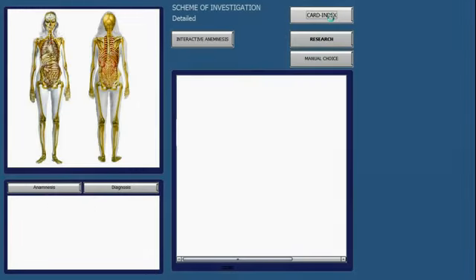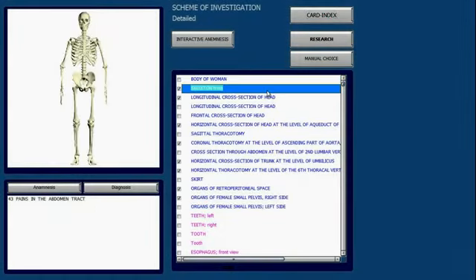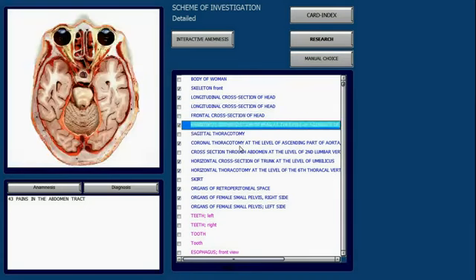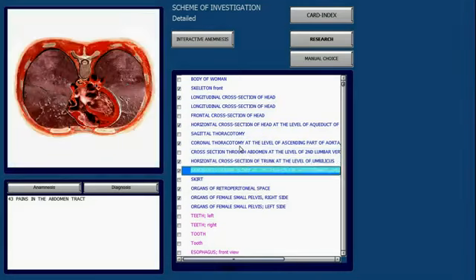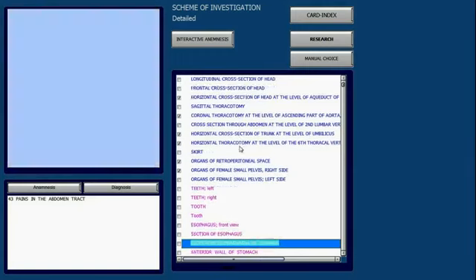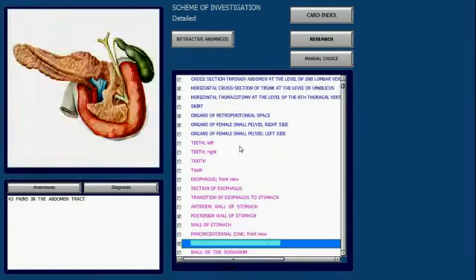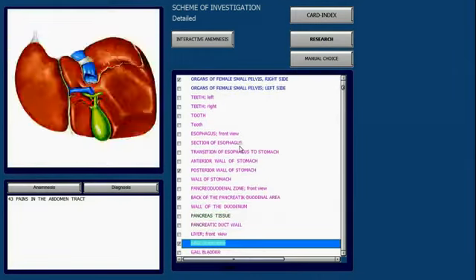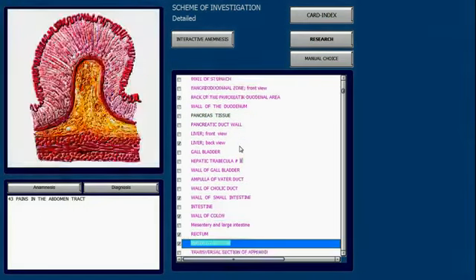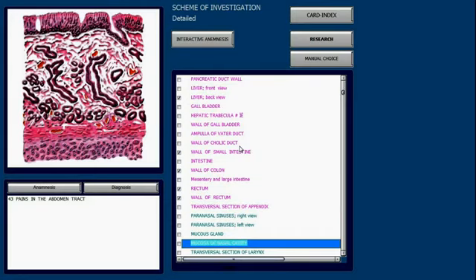We'll click on continue. Now we have the list of organs altogether at the bottom. If you see, there's 589 altogether, and you already see that there are some organs and tissues that are already checked. And basically, the reason why we were checking complaints on the previous page is to give the system an idea of what is going on and what we would like to see being checked.